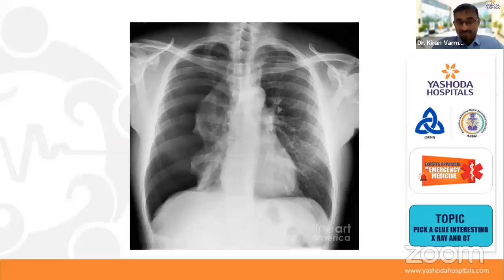Moreover, chest X-ray is also not required to confirm the diagnosis of pneumothorax. So okay, we have done it. Did you find anything over here? Which side is the abnormality, right side or left side? If you look at the X-ray, especially on the right side, just focus on the right side. Can you see the demarcation here? This is lung tissue, and the rest of the part is air, I mean pneumothorax. The pneumothorax is compressing the lung.